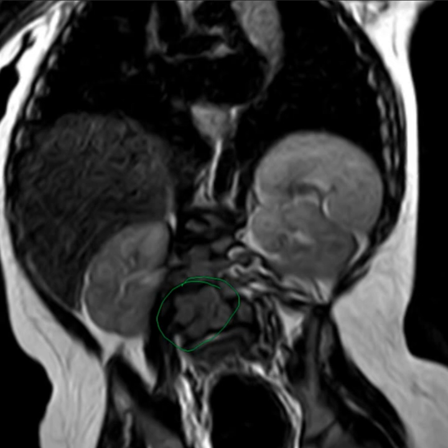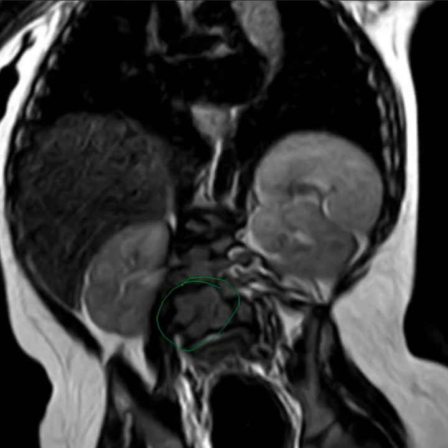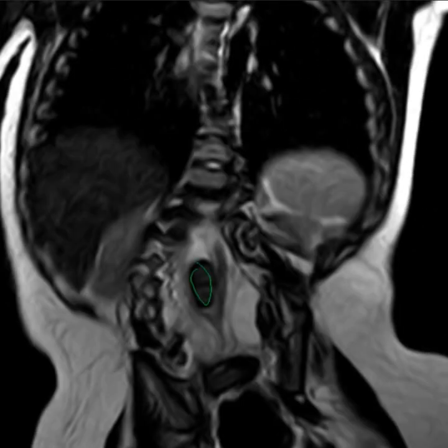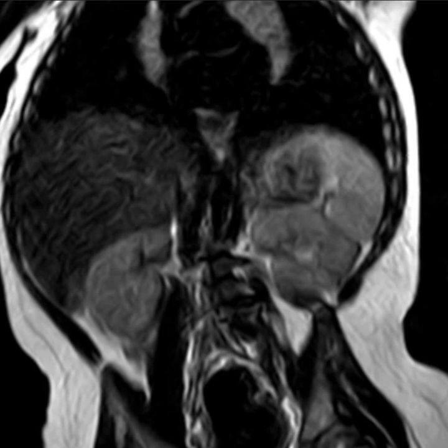There is fusion or near complete fusion of, I think, L3 and L4 vertebral bodies. And these are the vertebrae that are causing the bony spur. As we can see here, this is the bony spur, beautifully demonstrated, dividing the tethered spinal cord into two cords, and they are united distal to it here and tethered at the level of S1. Well, that was a very nice approach and good interpretation of the case.